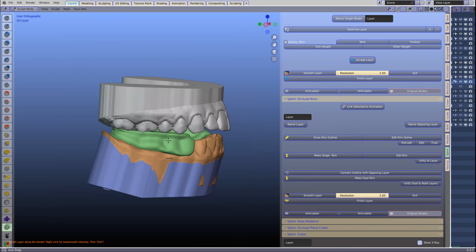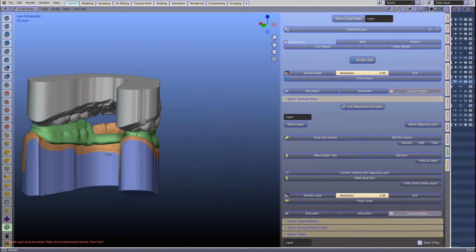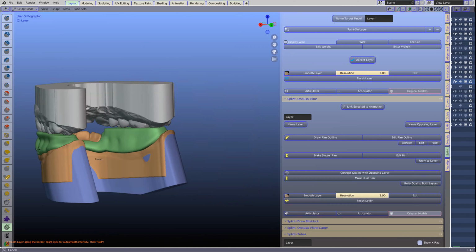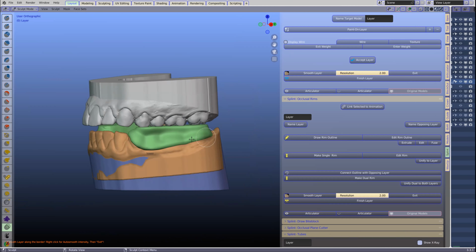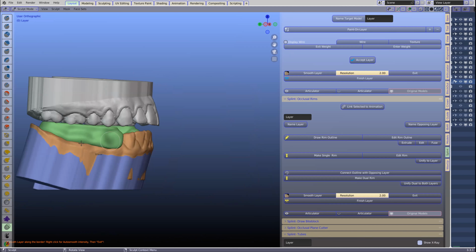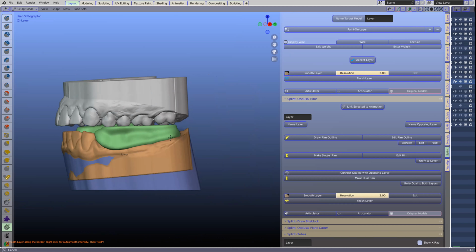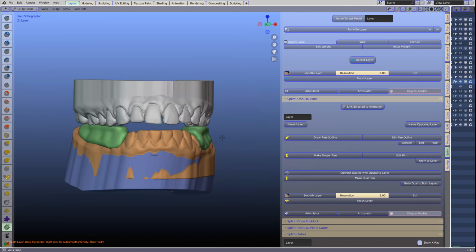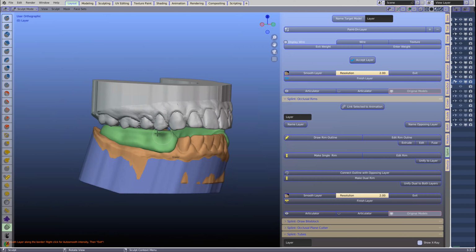Now, perhaps we shouldn't have deleted the articulation because we should still make a cut because you want some type of occlusion, isn't it? Yep. Yeah. So like now heavy occlusion. Okay. Yeah. So the thing is now we've actually, yeah.